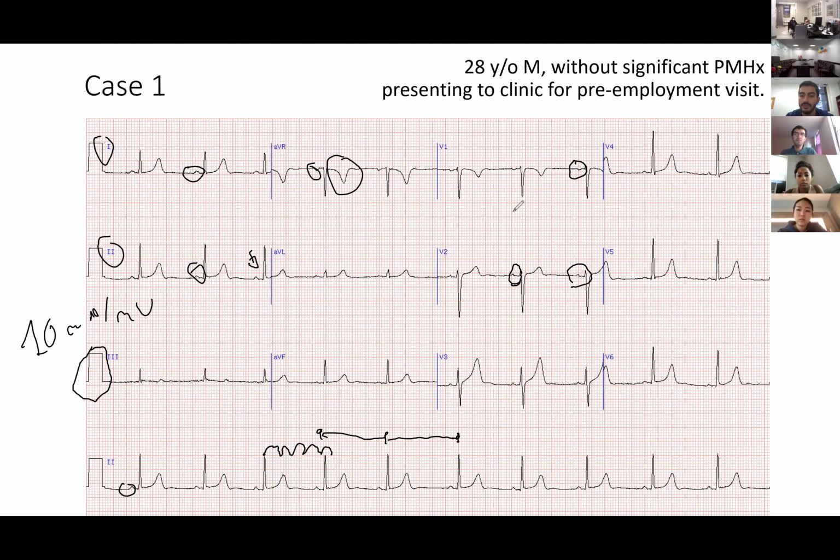But then you also want to see how the progression of the R wave is. So the normal thing is that from V1 to V5, you'll see how the R will be continuously getting bigger, right? The transition from R to S being more than 1, meaning that the R is higher than the S depth, is going to be between V3 and V4. That's the normal, okay? And then usually from V5 to V6, either it maintains the amplitude or it goes a little bit lower, but that's the normal, okay? Now, after that, you see your J point, which, as the name says, is the junction point. It's the junction point in between the QRS and the ST segment, okay?